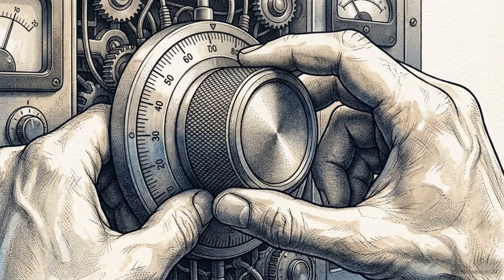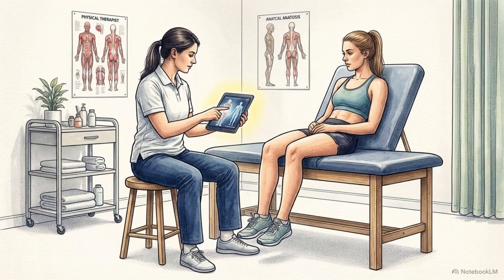The utility of clinical thermography relies entirely on the discipline of the physical therapist. Without strict thermodynamic protocols, the physiologic data is completely compromised. In clinical practice, the workflow moves from establishing this initial baseline diagnosis to the ongoing tracking of patient rehabilitation.